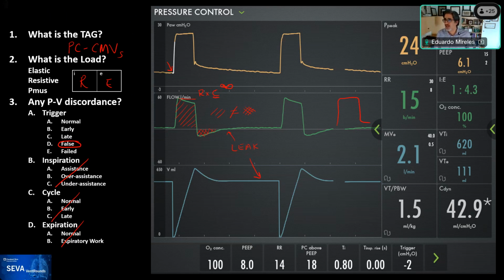Any thoughts here? Well, first of all, was this patient hypoventilating? Was the pH low? That's a good question. I am not aware, but you can. The first, let's go by questions. The first question that I would ask here is, which tidal volume do we believe?